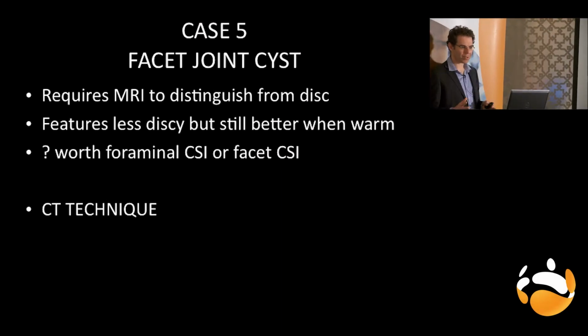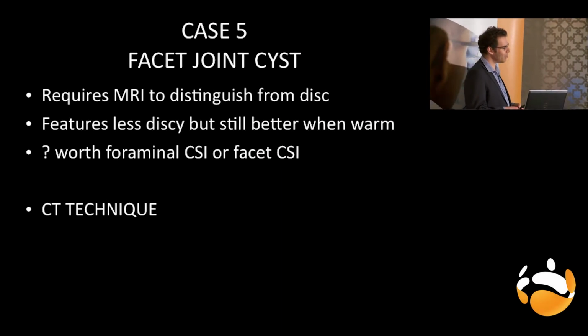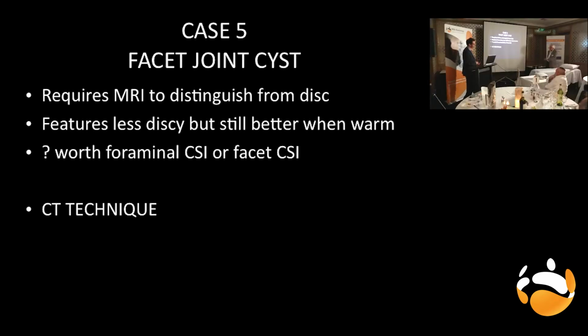Okay, this is a facet joint cyst. This is a rarer cause, so it's not always disc. We think disc, but sometimes there can be other causes of radicular pain. I think you might as well go through this.